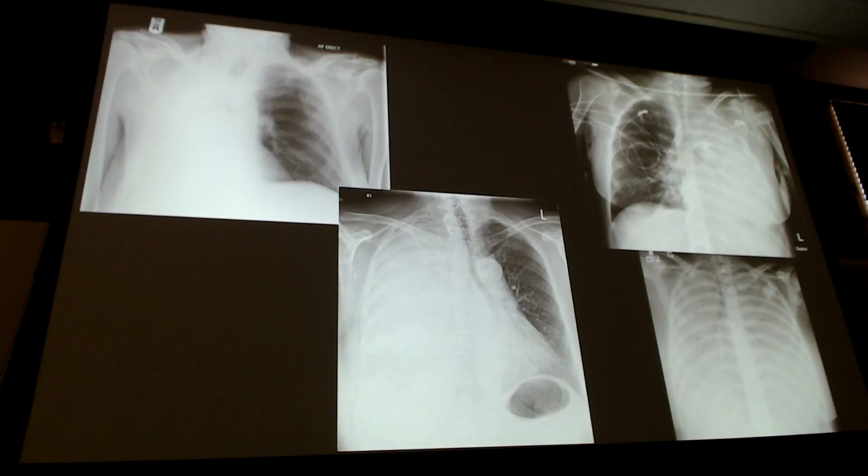But now it looks like my mediastinal structures in my trachea are shifting, but both lungs are opacified. So is it pulling? Is it pushing? Just off of the image, I have no idea. Right? So I put this one in here to again reiterate the fact that an image by itself is not all the time useful. It's going to be adjunct to stuff that you're doing.